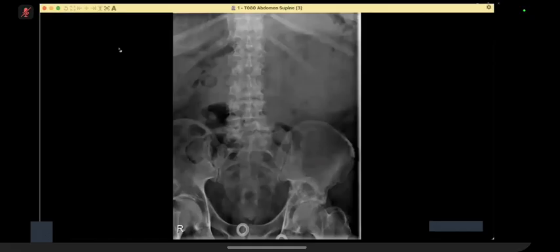I'm presenting a case: abdominal radiograph showing a soft tissue lesion in the left hypochondrial region. The soft tissue lesion is showing punctate calcification. I want to check the bone. The lesion seems inseparable from, or covering, the psoas muscle on the ipsilateral left side. I want to check if the lesion has any relation with the surrounding bone or any metastatic lesions.